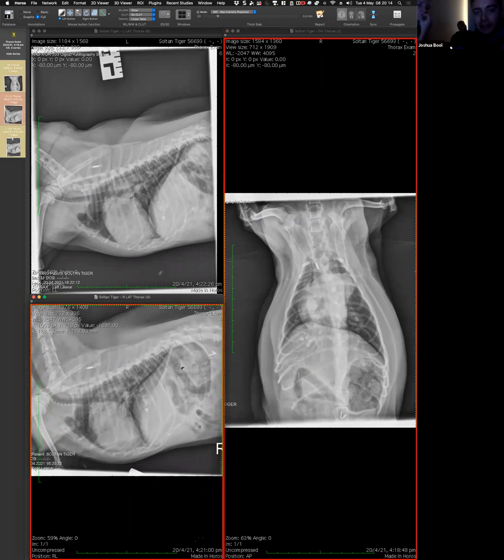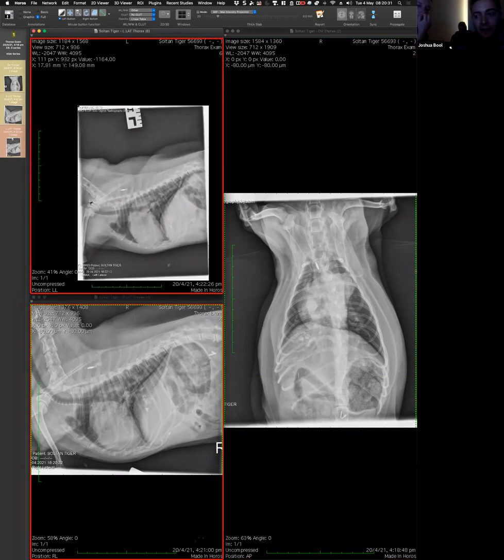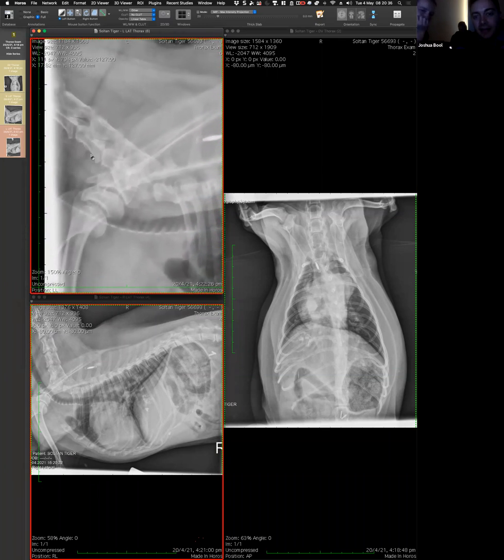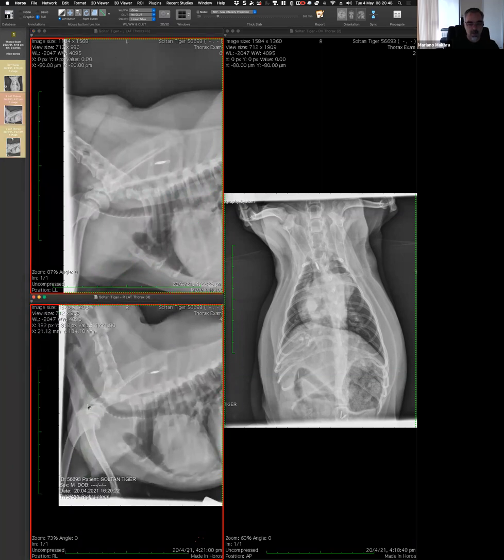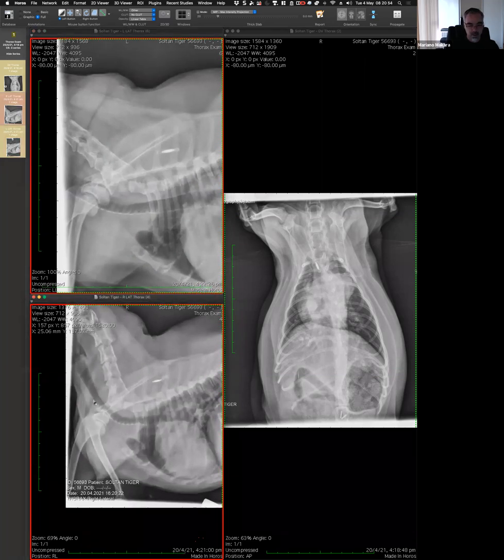Another thing, Mariano, as well. When comparing the left and right laterals, particularly on the left, the tracheal lumen looks a little bit decreased, just caudal to the shoulder joint. I'm not sure if there's soft tissue opacity dorsally, so I'm assuming it's just some evidence of collapse there from the membrane. Cool. So in a dyspneic animal, you are checking the airway as far as you can, as far as you're taking the images. That's important. So I agree, and very good comment.